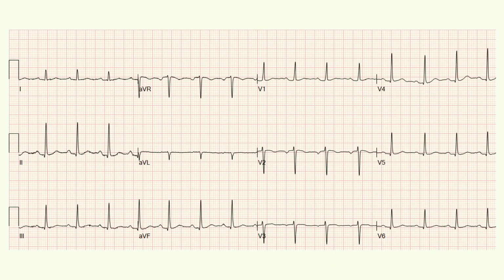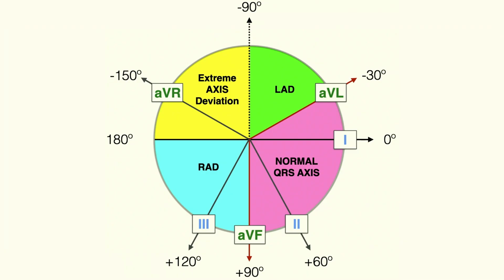Okay, so you look at lead 1 and tell me, is lead 1 mostly upright, QRS, or mostly upside down? Mostly upright. Lead AVF, same question. Upright. So now we go back here, and we go, OK, lead 1 was upright.